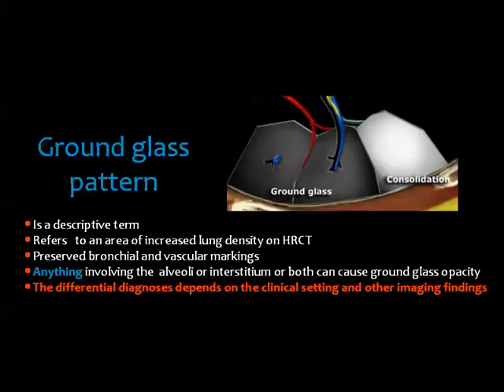Then we finish the first pattern, which is the interstitial or the reticular pattern. We said that we have about 6 in the differential diagnosis. What are these 6?